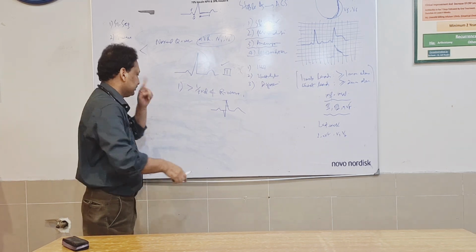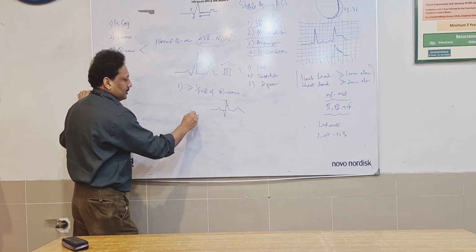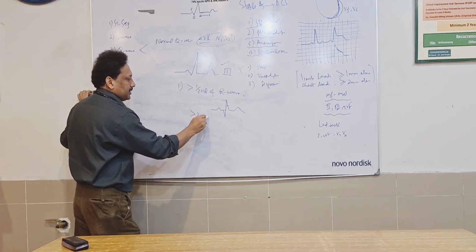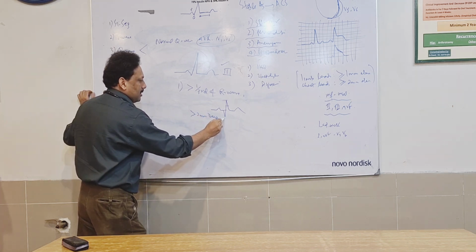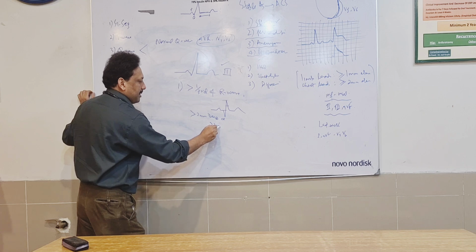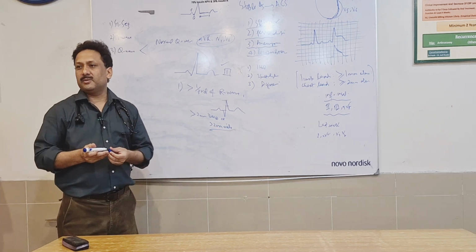Point number 2. If it is greater than 2 mm deep or greater than 2 mm wide, again it is known as significant.